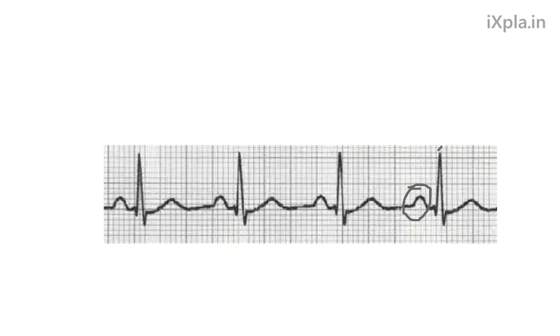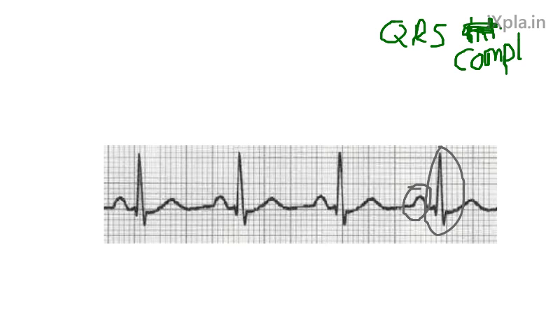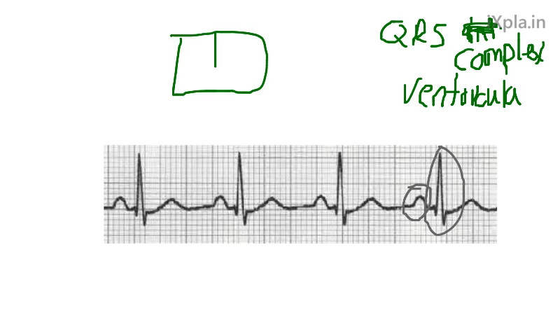And then you have this, which is the QRS segment. We'll switch to green. The QRS interval, sorry, the QRS complex. Okay, so the QRS complex is ventricular contraction. Ventricular contraction.